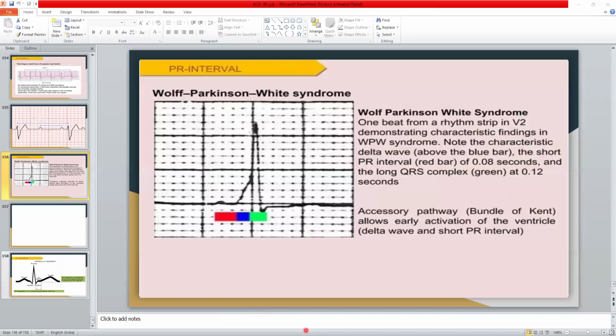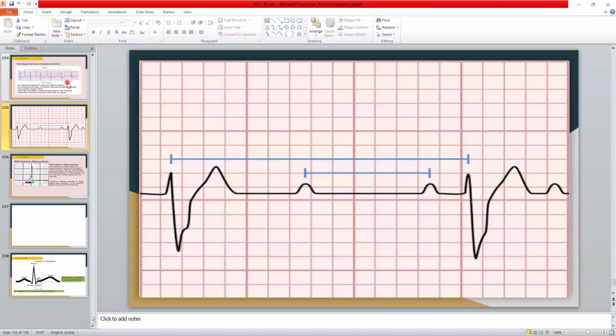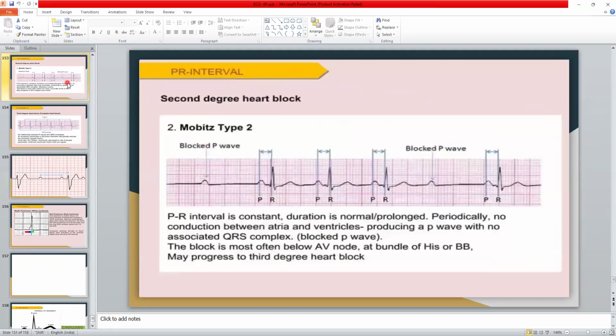Hello, yeah, tell me. Ma'am, the question is, is this PR interval abnormal in every lead, like lead 1, lead 2, aVR lead? Yes. If the PR interval abnormality is associated with other conditions, then you will find it in other leads also. But most of the time, this PR interval, what I have told you, occurs in all the leads, but is better seen in the long strip.